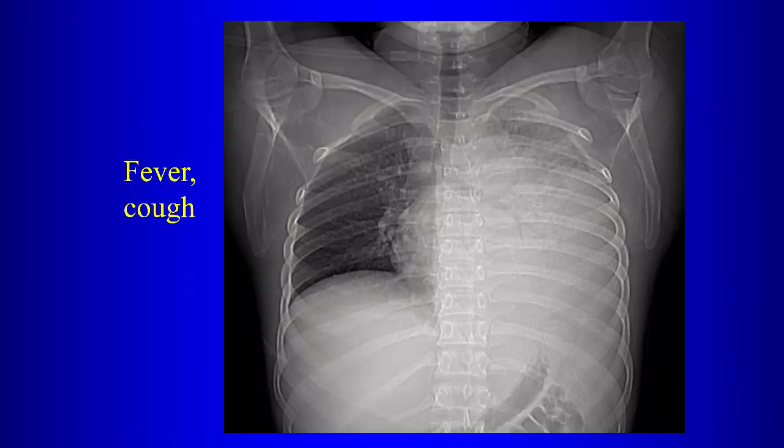What about this? Was that a normal or abnormal chest radiograph? So what's abnormal? Could just be giant. You see the air bronchograms. So you think it's just airspace disease, or is there something else also going on there? Okay. So could be a large pleural effusion, right?